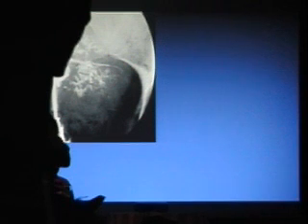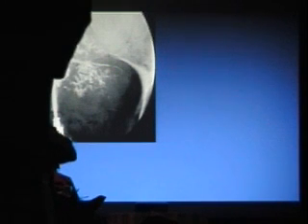So this is adenomyosis, of course, classic appearance. You don't see it on hysterosalpingography too much anymore, but these are the pseudodiverticuli, the contrast as it's going out of the endometrial cavity. Adenomyosis, as you know, is ectopic endometrial tissue in the myometrium. Endometriosis is the same disease, but the tissue is now ectopic everywhere else in the body except in the myometrium. So the same disease, different names.